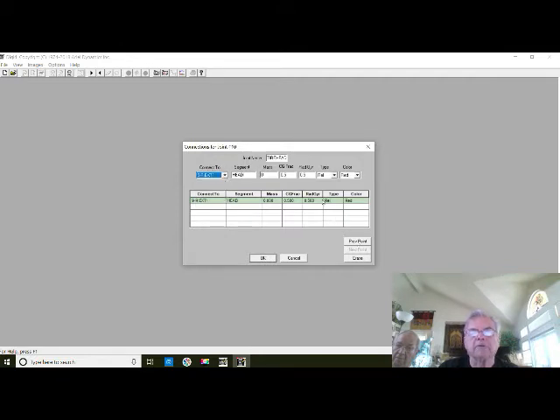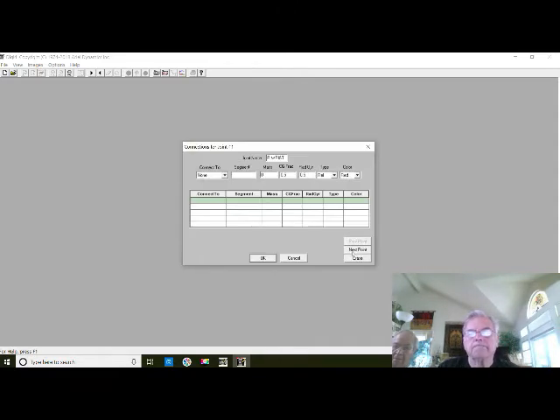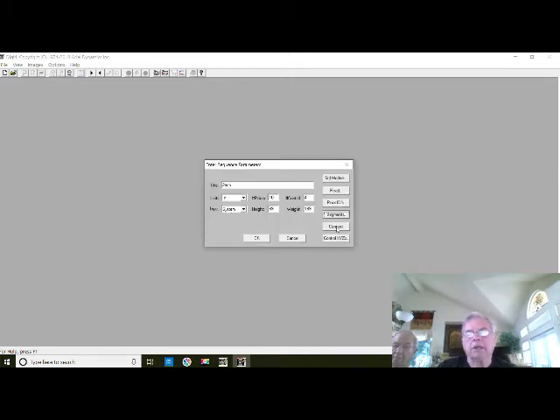Go back to the previous frame, and we'll change this to the chin. So now I've created a new segment called the head. All the rest of the segments are prior programmed for me. Looks good, I say OK. I'll connect the points. And now we have 4 control points.